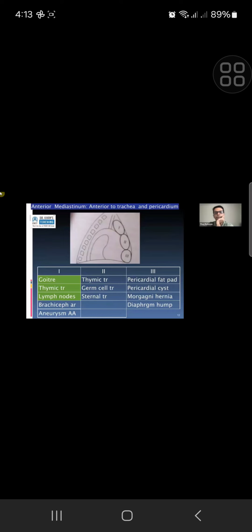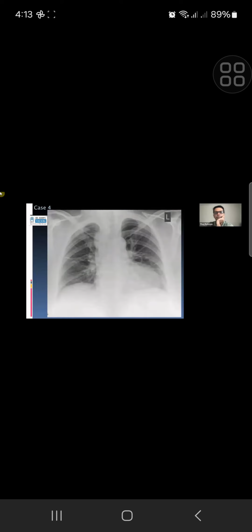Okay, next case. Sorry, yeah, just as a repeat of the same thing. Okay, go on, next case.